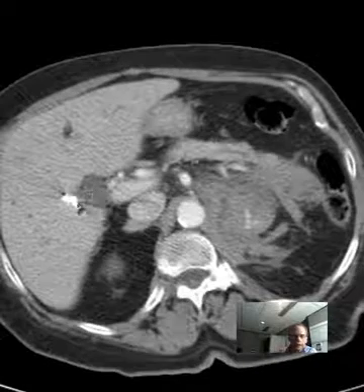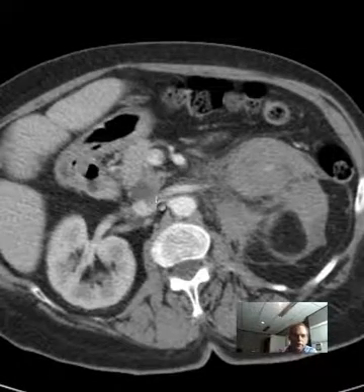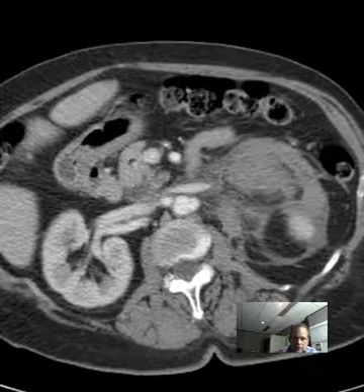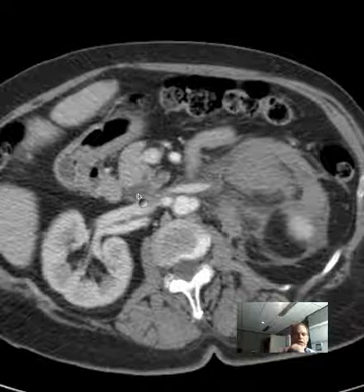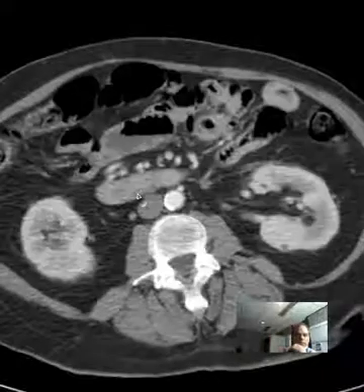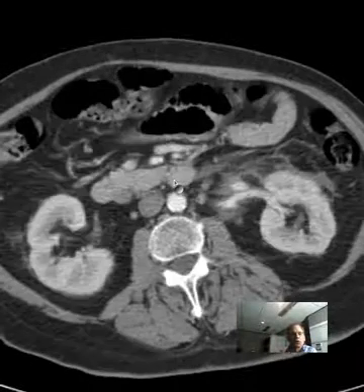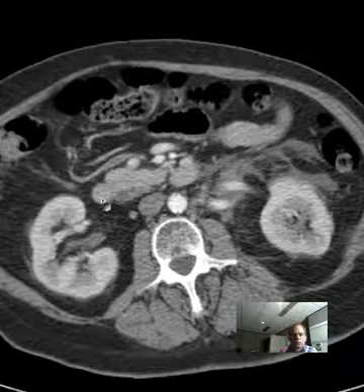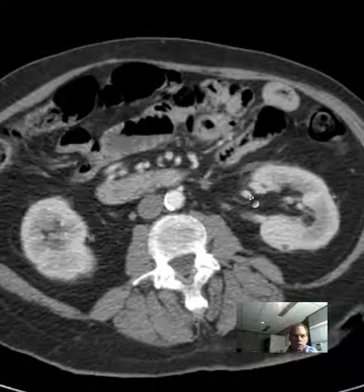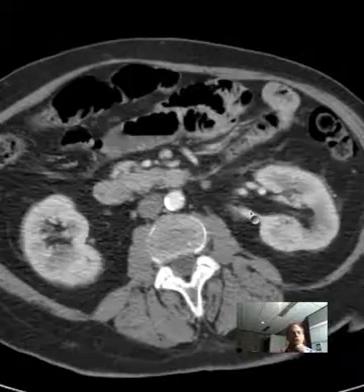A patient had the gallbladder out, and here you can see the common bile duct going toward the pancreas through the head of the pancreas, which is not real well demonstrated here, but this is the head of the pancreas here, and the distal common bile duct should be emptying out into the duodenum, which is right here. And if you go farther, you see the transverse or third portion of the duodenum. You go up, back again, and here you have the second portion of the duodenum, which is the vertically oriented portion. And if you look at this common bile duct and watch closely, it just kind of disappears right at this level as it merges with the second portion of the duodenum.